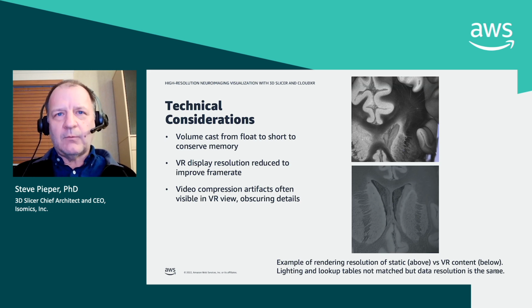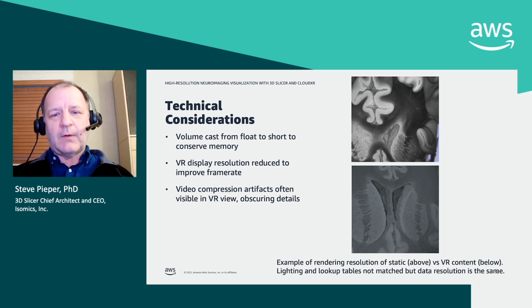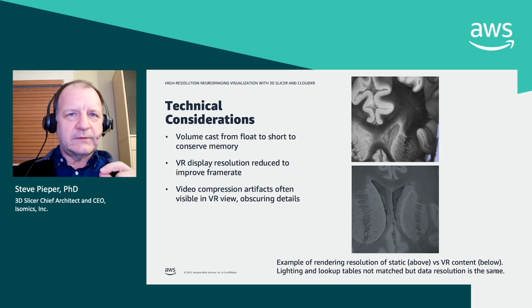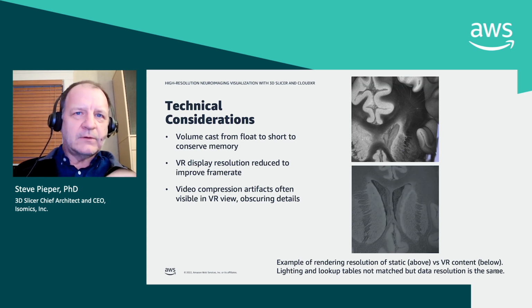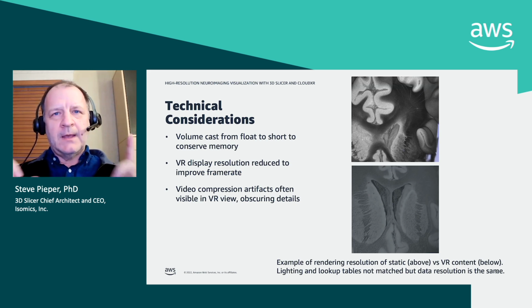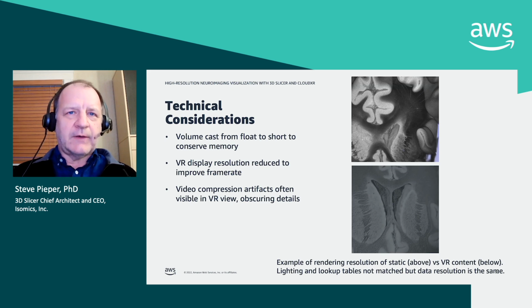And everyone, when interacting with this, there are times when things would take a while to render, and there would be a little bit of lag, maybe you noticed in that video, but also there are some compression artifacts visible. It's not as sharp as looking at a monitor with the same thing rendered. You can sort of understand that because when you're looking at it in VR, every frame is new. Every time you move your head, it's giving you a new, fresh frame. Whereas with traditional mouse-based rotation, you stop and any compression artifacts get washed away when the full res data shows up.